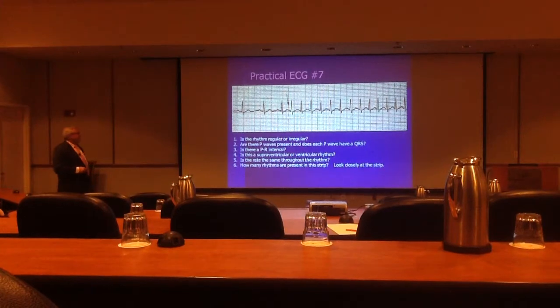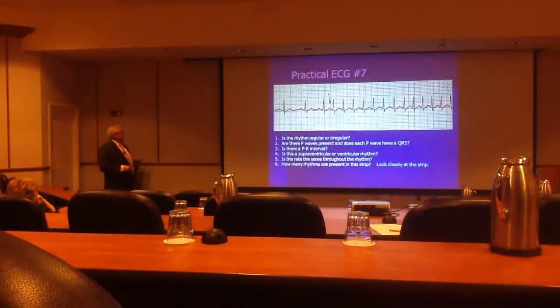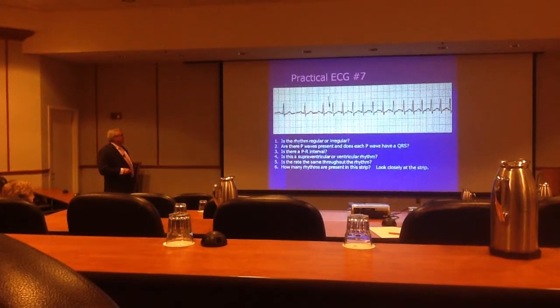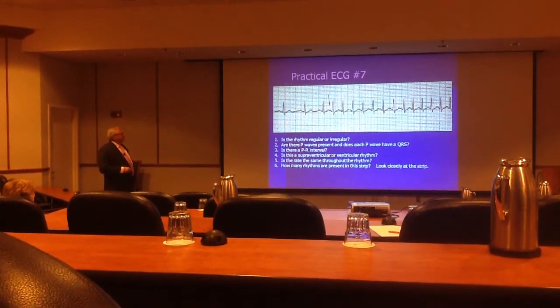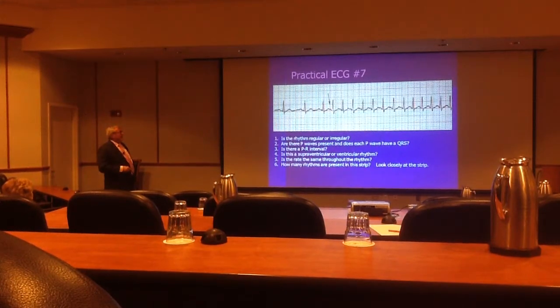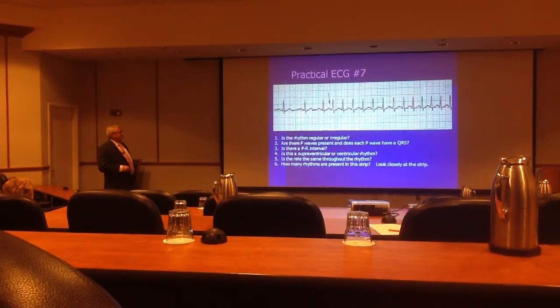So in the beginning here, we have a PQRS, PQRS, PQRS. There's a fixed PR interval. The QRS complexes are normal. This part is normal sinus rhythm. But then, all of a sudden, something happens early. There's a premature beat because this distance is shorter than this distance. And I look to say, well, that's a premature beat. What kind of premature beat was it? Well, I find a P wave. It occurred earlier than normal. The QRS complex is narrow, so that meant that this was a PAC.